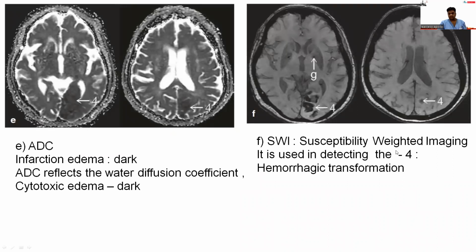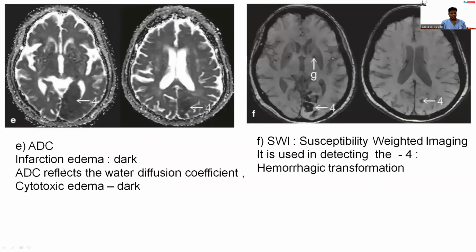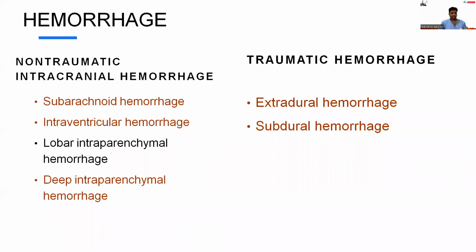ADC and subsequent images are also obtained, but they are very difficult to interpret. And here, infarction edema looks dark. That is, cytotoxic edema looks dark.